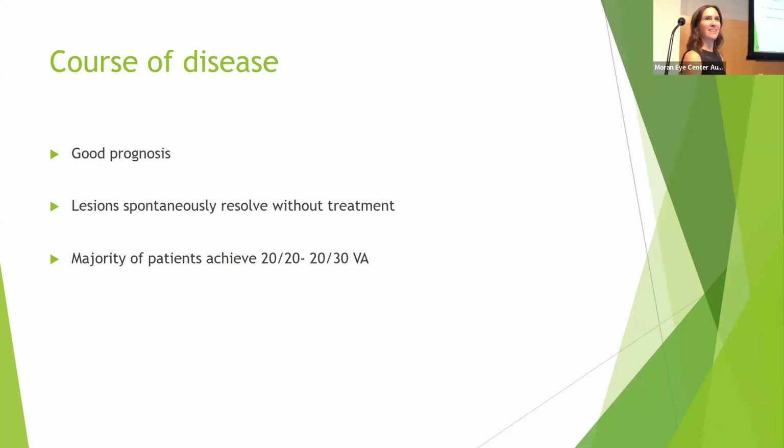So our patient probably didn't need that much prednisone. And if you remember, the autofluorescence 2 weeks after starting the treatment actually looked worse. And so we always have to pause and think, is our patient getting worse on steroids? But in reality, this was probably just the disease taking its natural course. It was still evolving. The imaging can evolve with it, sort of despite our interventions or treatment.